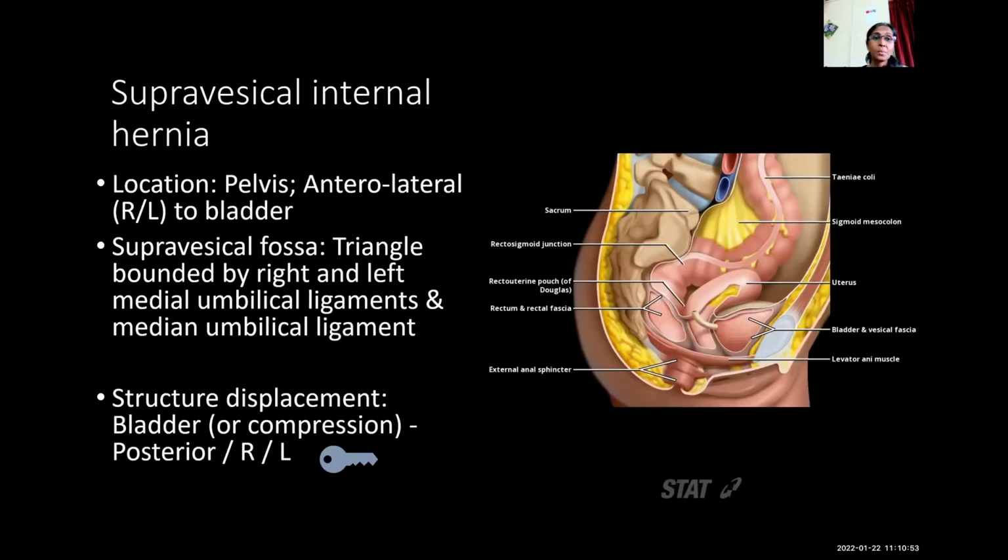So with that, we are done with the abdominal internal hernias. In case you are confused, I again want to say: one, you know that it's a closed loop, so look for complications of closed loop like strangulation or reversible ischemia. That will tell the surgeon that this patient needs to go to surgery. Then go one step further and see whether it would fit into any of the classical types that we have seen, by virtue of displacement of the stomach or colon or SMA, SMV, IMV, colic vessels.